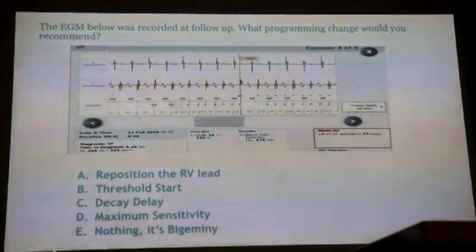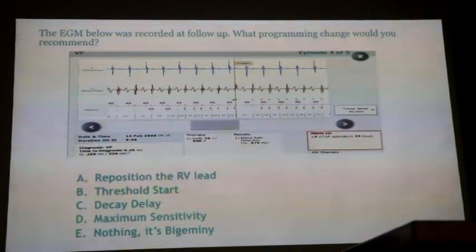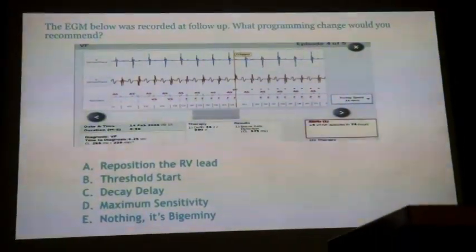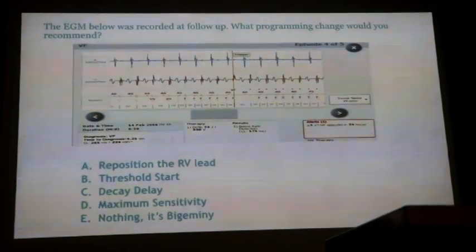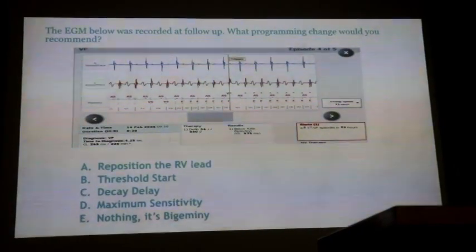And interestingly, this patient is a bit tachycardic, right? It's not that tachycardic, but he's a bit tachycardic. One of the things we would see in the past is that R waves go down on tachycardia, right? And you remember yesterday, that differential sensing? I think it's just leads moving around a lot.